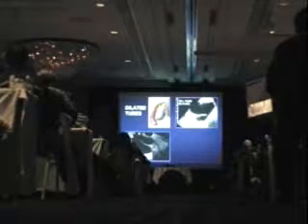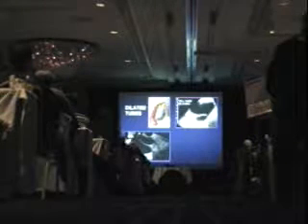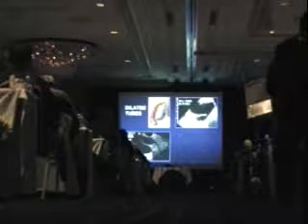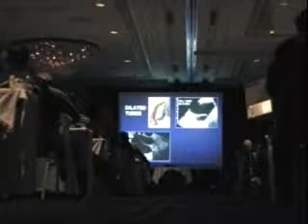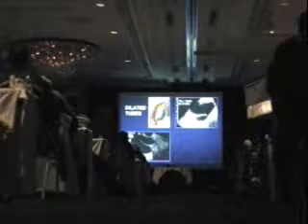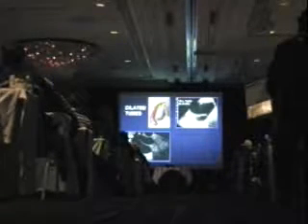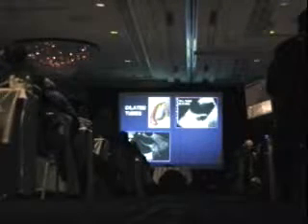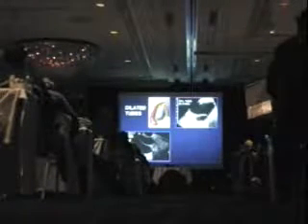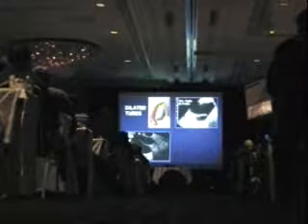Dilated tubes, well, we can see from Dr. Netter's diagram that the ovary is often encompassed or embraced, if you will, by a dilated tube. And we can see that on the ultrasound as well, particularly at the fimbriated end, which is often larger than the more proximal portions of the tube. Notice how it typically folds upon itself. Two examples. So it's that configuration, that folding upon itself, embracing, as we can see here, the ovary. And that's really what you want to look for.